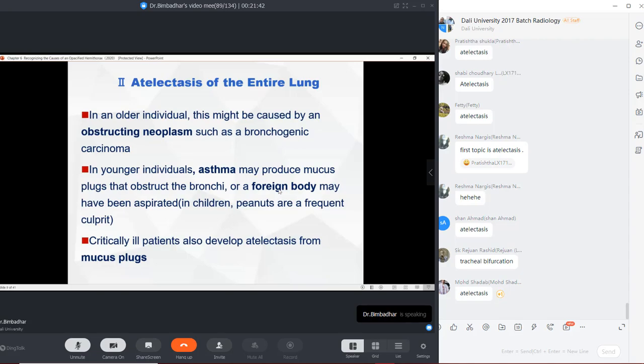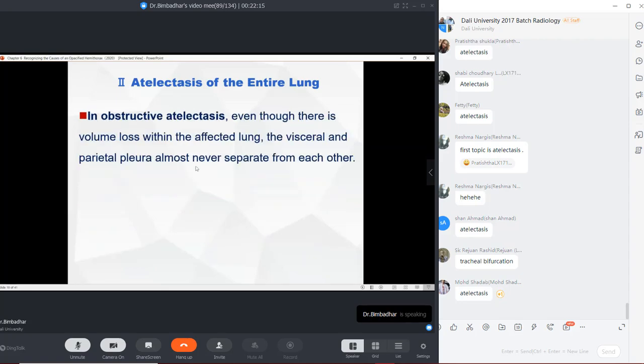Now we were talking about the general principles. The foreign body can be obstructed. If a foreign body is obstructed, we indicate a chest X-ray to find out the location of the foreign body. That same strategy should be applied here to find out which part of the lung is obstructed, which further bronchus or the further branch of the tree has been obstructed. You have to try to know the exact location so that you can decide the treatment of the patient. Okay, now let's try to look at some radiographs.